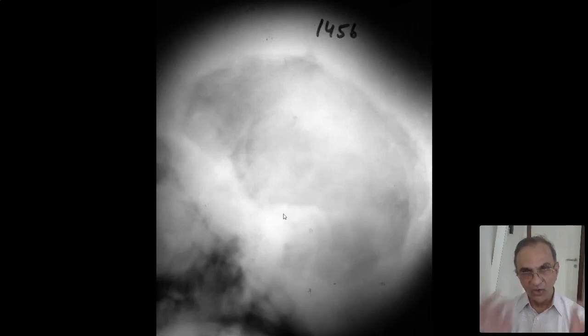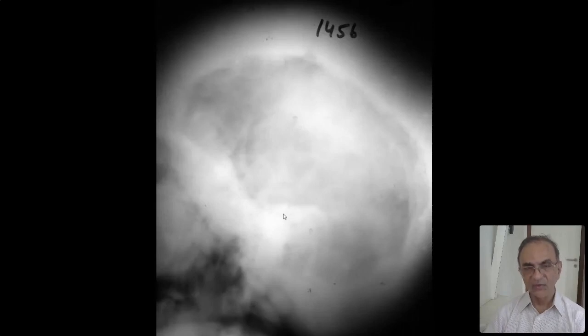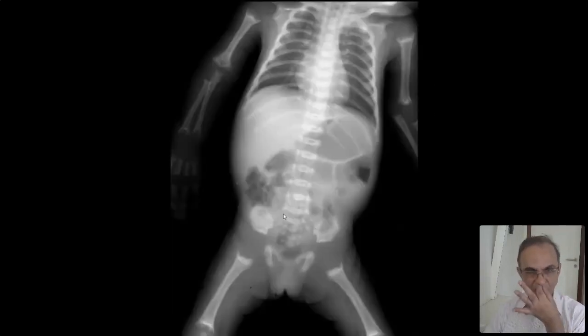Repeat, why is it not osteopetrosis? The skull is also sclerotic, the skull wall is widened, which does not happen in osteopetrosis, pycnodysostosis, or cleidocranial dysostosis. When you see something like this, it is craniodiaphyseal dysplasia. Uncommon, you have not heard of it, you can forget it except in the exam. Okay. Now, this is what I meant.